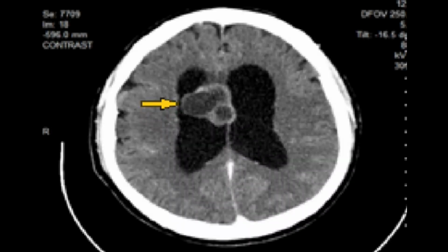Here on this CT axial image, you can appreciate an isodense to hyperdense, well demarcated lobulated mass, and it is arising from the lateral ventricle. However, in that particular case you cannot appreciate the calcification. Cystic elements are quite pronounced, and it is also associated with obstructive hydrocephalus. So this is an example of the ependymoma.